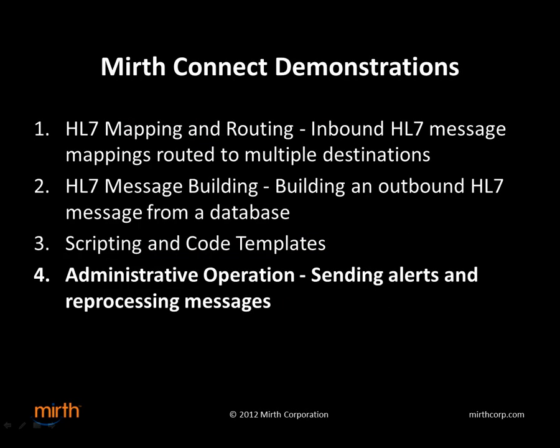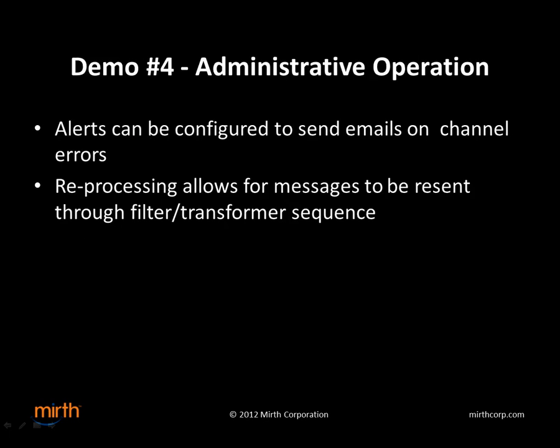In this demonstration, I'm going to show administrative operation of Mirth Connect. This will involve sending alerts and reprocessing messages. First, I will show how alerts can be configured to send emails on channel errors. Next, I will show how reprocessing allows for messages to be resent through the filter and transformer sequence.